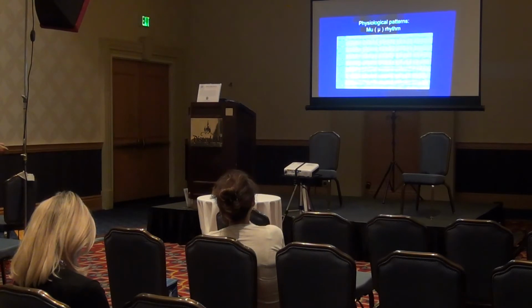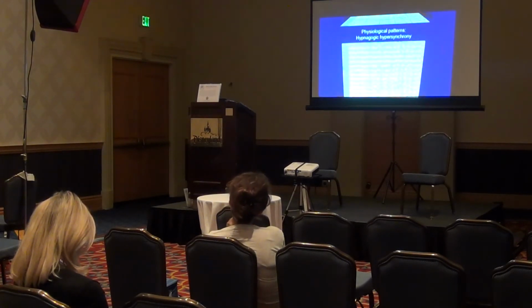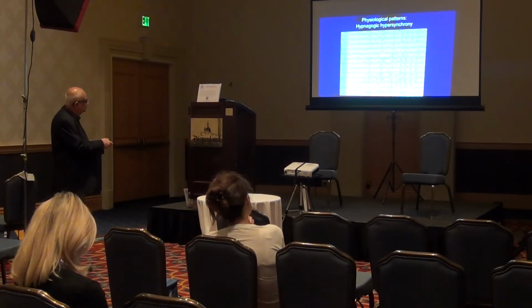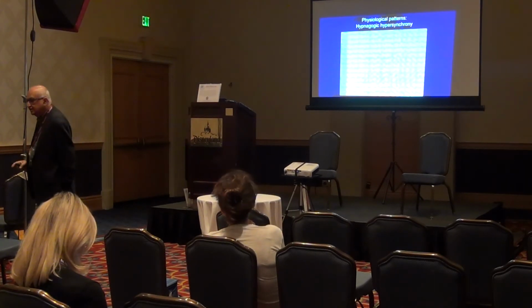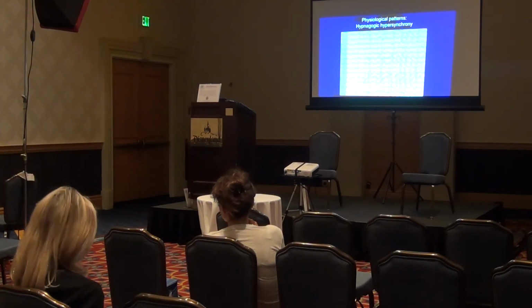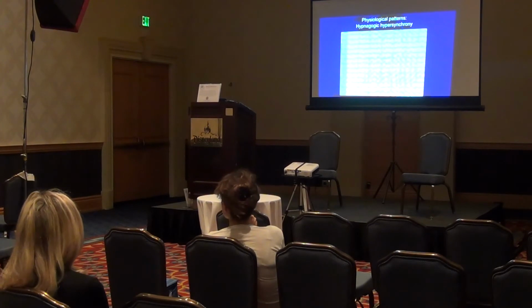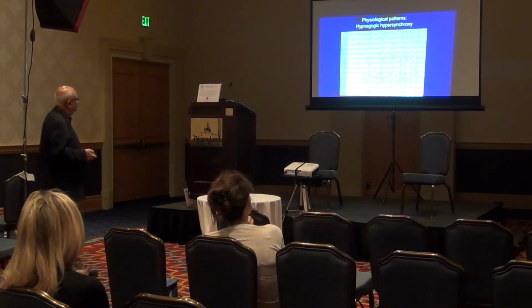Okay. So that's called a mu rhythm, that's normal. There are others, this is very funny. If you are a non-encephalographer, that looks like somewhere here he started a seizure and it went from here to there. Except that it isn't. It's called hypnagogic hypersynchrony. That means particularly young 10, 12-year-olds, when they get sleepy, they get these giant waves. There's a lot of synchronization. The neurons tend to fire synchronously, but it's not a seizure, right? It's a normal, acceptable pattern.